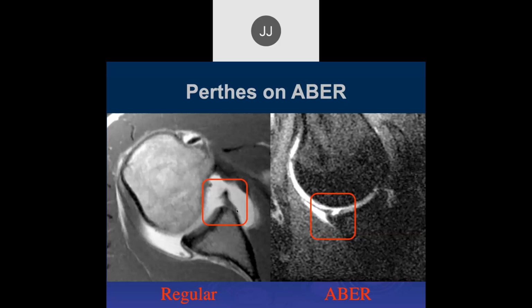And then as the reduction occurs, that's put back in, more in place where it should belong. But quite frequently, as we can tell, a lot of these do not go back to where they belong. They just stay hanging out there. But they were out there a lot further right after the dislocation. Thanks, John.